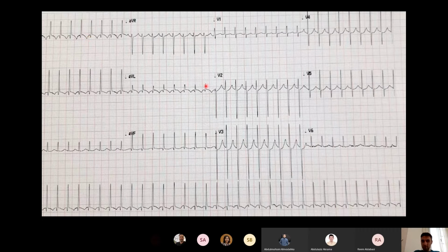This is something fast. Let's say this is a 12-year-old, and the heart rate is like 240 beats per minute. So non-sinus, narrow complex, fast. Then you think your main differential will be SVT, right? Yes. Okay, this is very common. Regardless of what specialty you go into, you will probably see an SVT once in a while. This is a very common tachycardia.